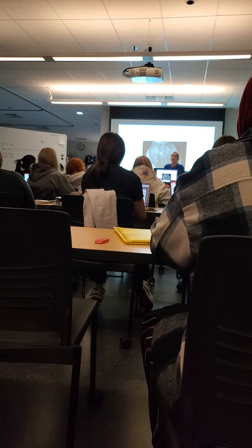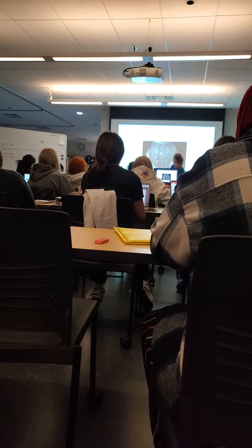So it will never be anything else about that. So when you're looking at this image, can you just describe what you're seeing? Yeah. So the cat scratch. Oh, the cat scratch signs.